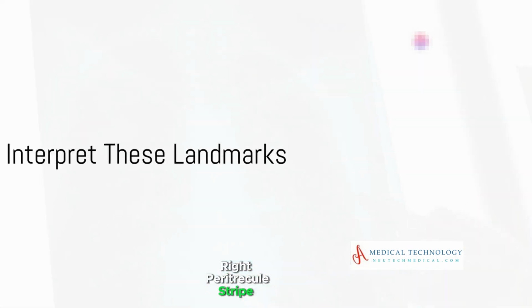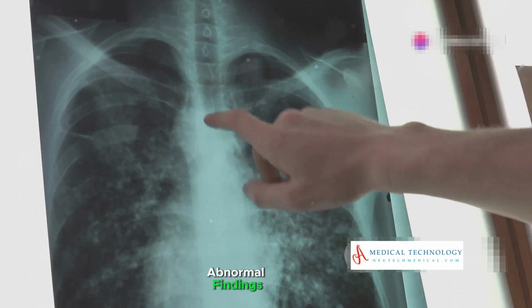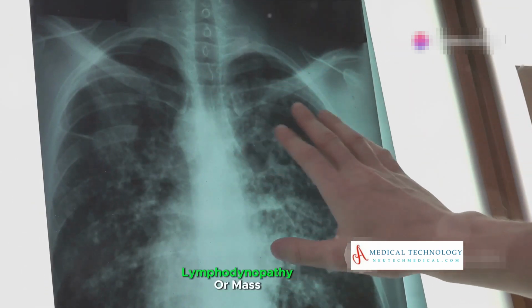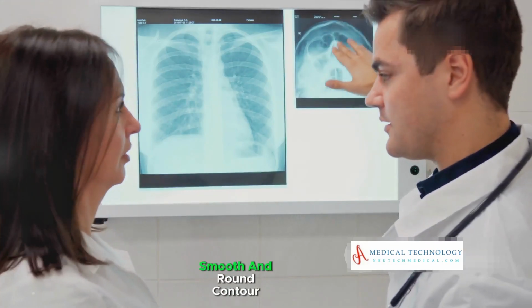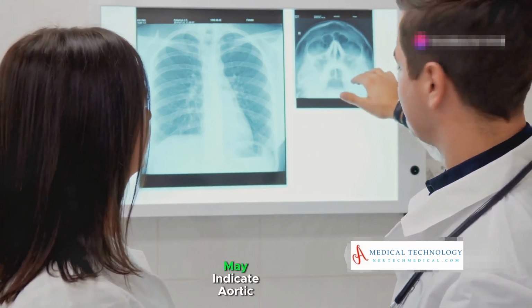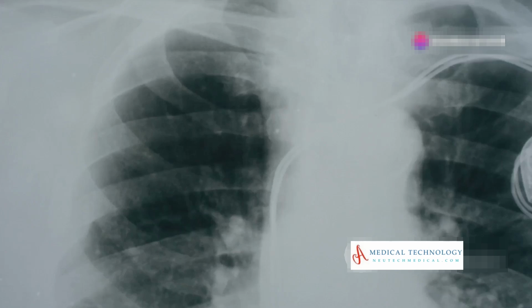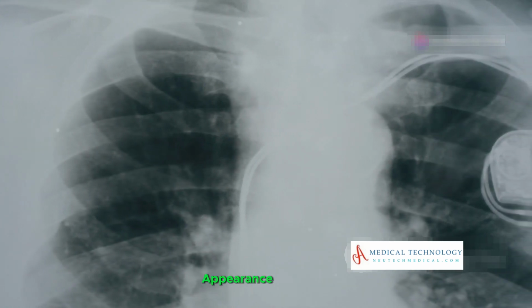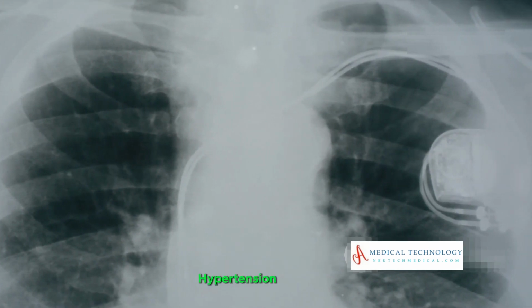Right paratracheal stripe, normal appearance: thin, less than 4 mm. Abnormal findings: widening can indicate lymphadenopathy or mass. Aortic knob, normal appearance: smooth and round contour. Abnormal findings: prominence or irregularity may indicate aortic pathology such as aneurysm or atherosclerosis. Pulmonary trunk, normal appearance: small round prominence. Abnormal findings: enlargement suggests pulmonary hypertension.